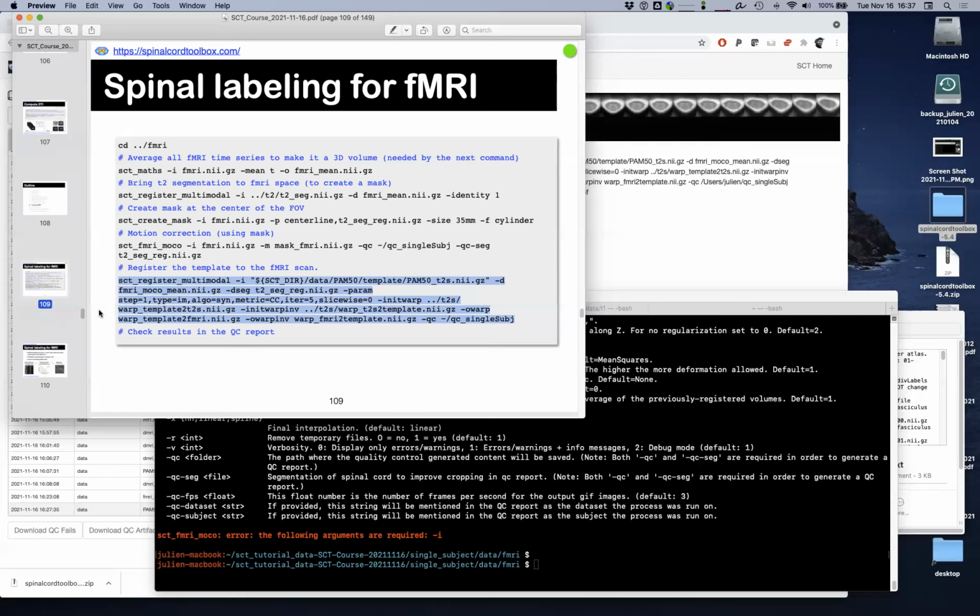But smoothing, that's something we'll see in one of the slides later, will also depend on your current slice thickness. If you have very thick slices, then smoothing might be problematic because it might also include some interpolation error, especially if the cord is curved.